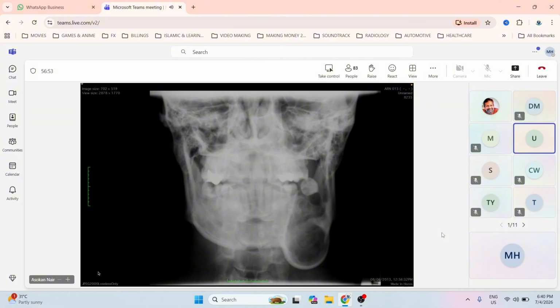There is no soft tissue component. The visualized maxillary sinus is also preserved with no evidence of air fluid level. I also cannot appreciate any impacted teeth in this radiograph.